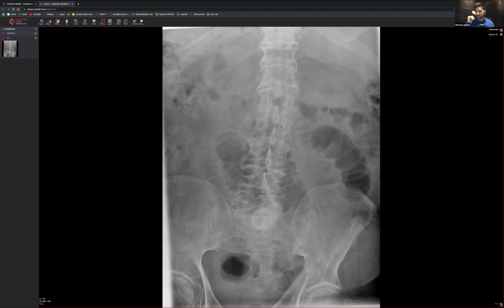So first off, we're looking at an abdominal film, and we can see what looks like multiple loops of dilated bowel, all sitting within the central abdomen. So that's the clue. The other clue is to see whether they've got haustra or valvulae conniventes. Let's reset this image. Valvulae conniventes are lines that go all the way across. Haustra go only part of the way across. So if it goes all the way across, you're looking at small bowel. If they go halfway, that's going to be large bowel. So this is actually going to be small bowel.